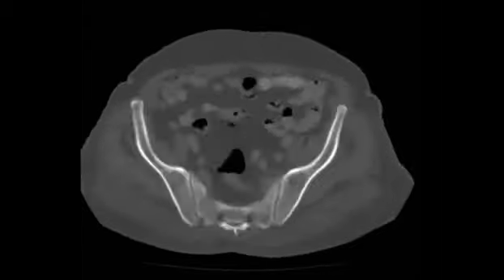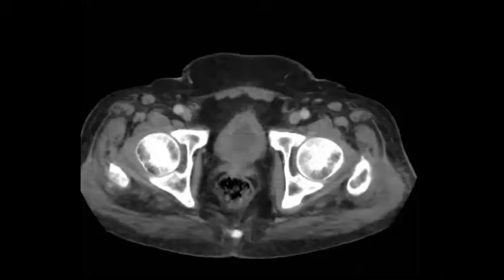Okay. So now I will shift to the mediastinal window. I try to collect the findings with you, right? Now it's a bit difficult to collect who tells the answers completely. So at least I see that you are giving pulmonary nodule. Everyone already mentioned pulmonary nodule. And maybe most of you mentioned liver lesion, if I am not mistaken.